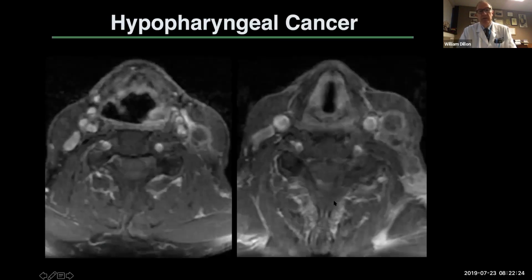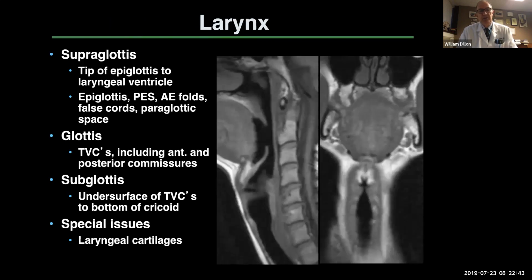And this is an area that is right above the esophagus and larynx, but below the oropharynx. And we'll normally see cancers arising in this. Here's a patient with a cancer of the piriform sinus with lymph node metastasis, a hypopharyngeal carcinoma.